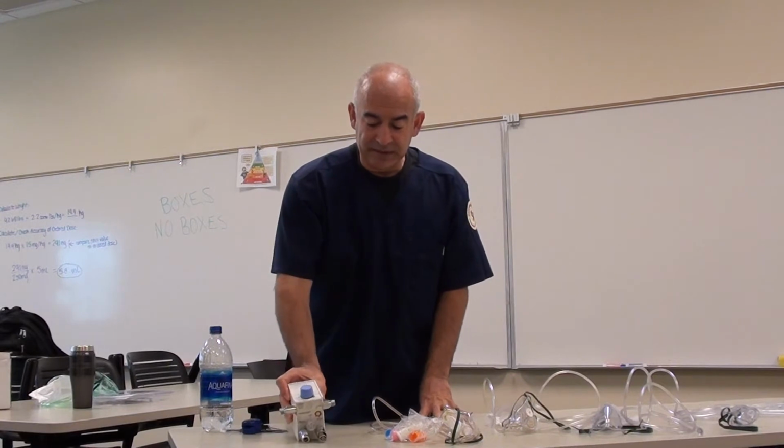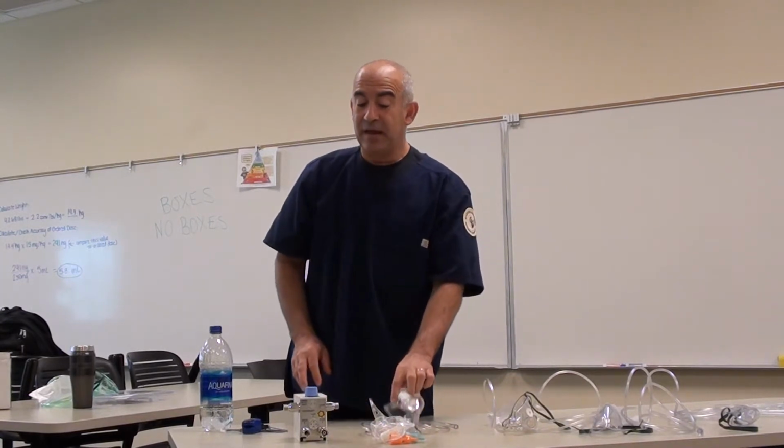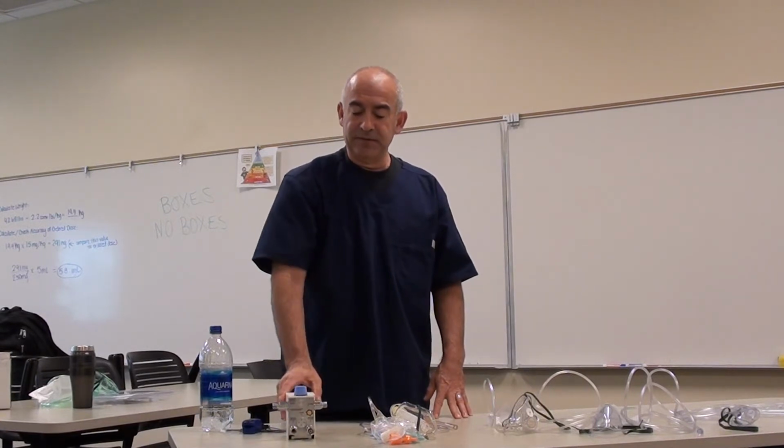And just to reiterate, these two particular devices, because they are high flow devices, are fixed FiO2s. Again, that is part of being able to qualify as a high flow device, that it offers fixed FiO2. The O2 blender is good for patients who require high flow and high FiO2 requirements.